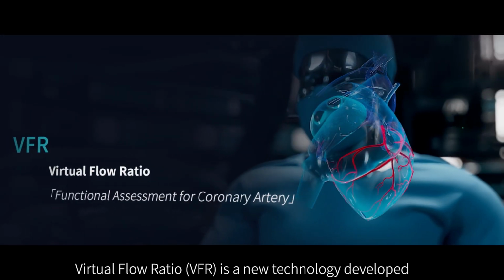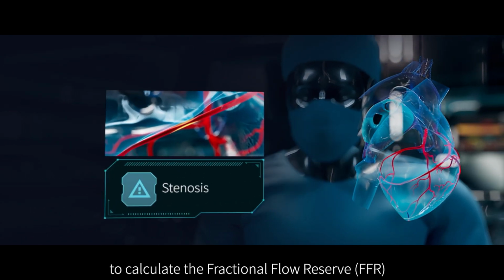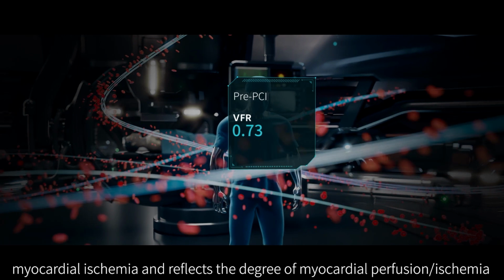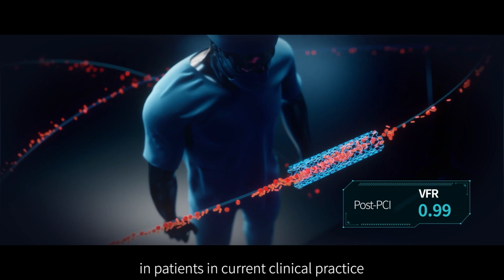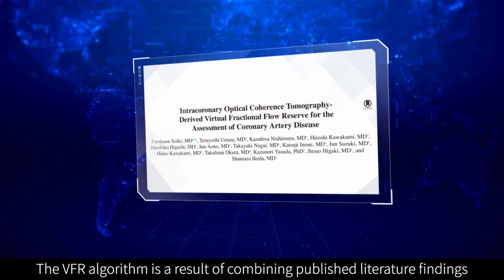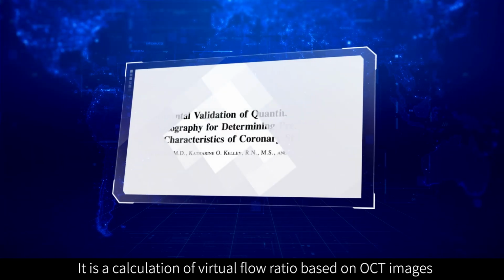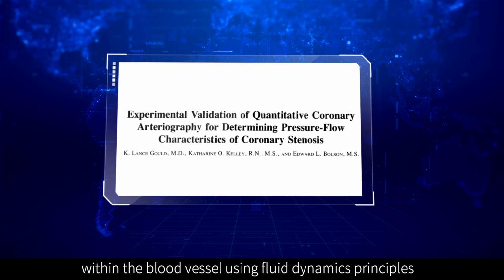Virtual flow ratio is a new technology developed by Vivolight Medical based on OCT image simulation to calculate the fractional flow reserve like FFR. VFR also uses 0.8 as a reference standard to evaluate myocardial ischemia and reflects the degree of myocardial perfusion/ischemia in patients in current clinical practice. The VFR algorithm is a result of combining published literature findings from abroad with the independent innovative design of Vivolight Medical. It is a calculation of virtual flow ratio based on OCT images, achieved by building a pressure loss model within the blood vessel using fluid dynamics principles.